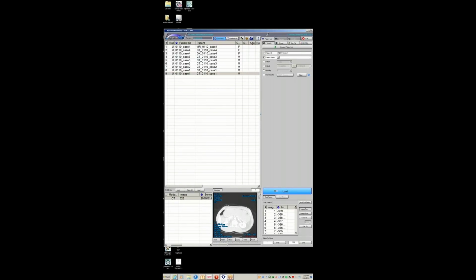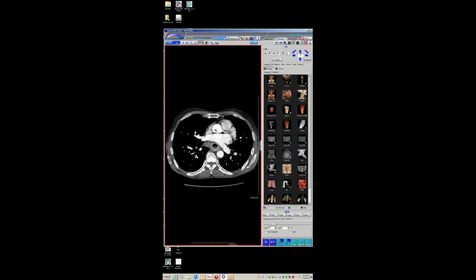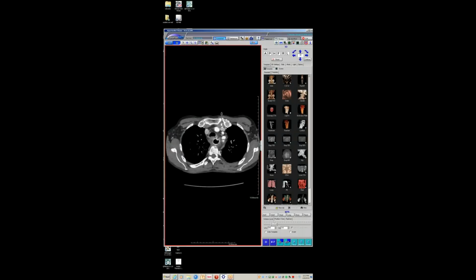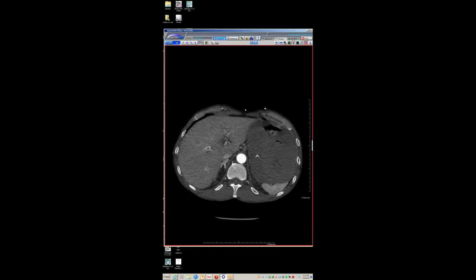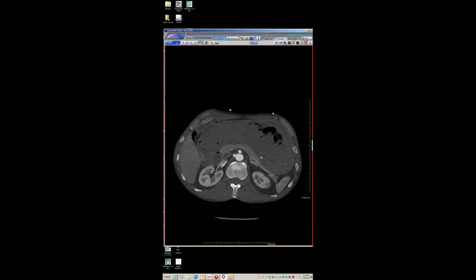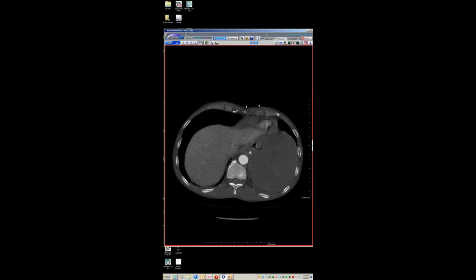Yeah, sure. Okay. So this is a bad, nice case. Guy with esophageal cancer, bad, ugly stent, recently diagnosed, comes in a few weeks after the stent was put in, and this is not related to the stent, but the first clue is that he comes in with lots of bad things, like coughing up copious amounts of blood. You can see the stomach is distended, filled with lots of blood.